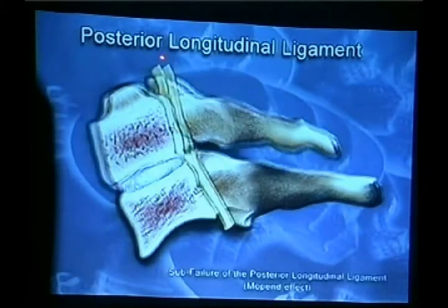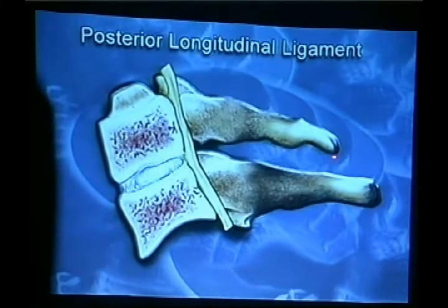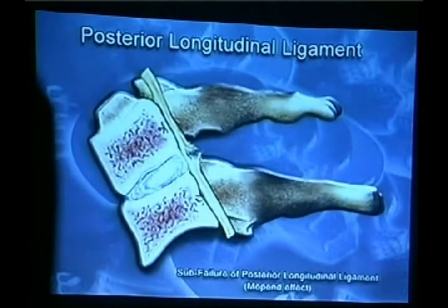Posterior longitudinal ligament is in the back of the neck. If the bone shifts forward, we tear that posterior. Or like on the girl we just saw, this bone is going to rock upward, increasing that disc angle like I just showed you. And here you can see right away, you follow, it drops down right there. And it's fixed. This bone isn't moving. So this shifts way down, and that's almost 3.5 millimeters.